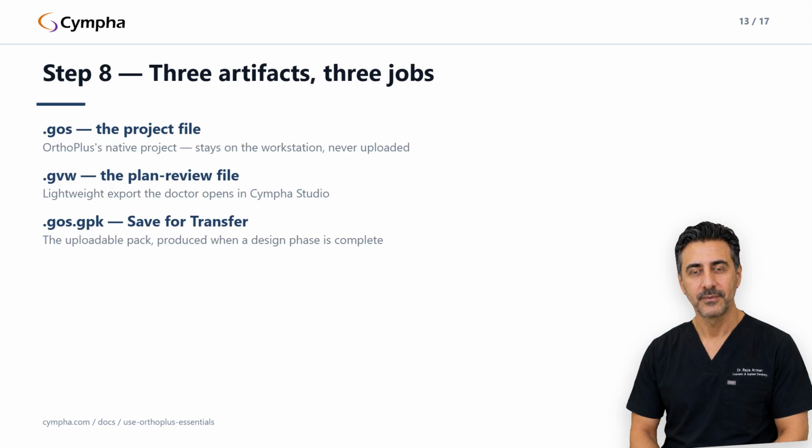Step 8. Saving and knowing which file does which job. Three artifacts matter, and they are not interchangeable. The GOS file is the project, OrthoPlus's native format. One stable file per case, saved and reopened across sessions. It stays on the workstation. It is not the thing you upload.